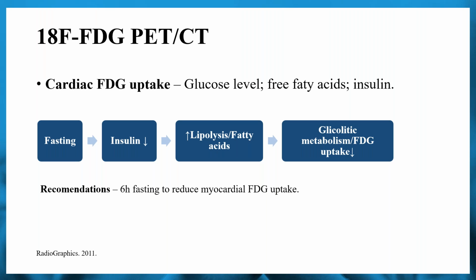That's why it's recommended to fast for at least 6 hours before the exam, to reduce the myocardial FDG uptake in order to create a viable contrast between the normal tissue and the tumoral tissue, which, when presenting signs of malignancy, may present a higher FDG uptake.